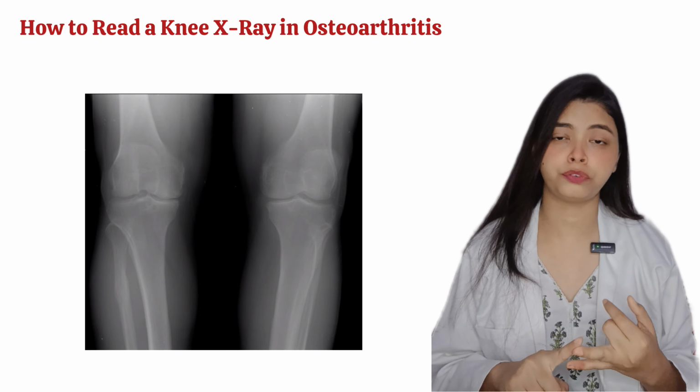Now let's discuss all the steps which are used to interpret knee joint osteoarthritis, and at the end of the video we will discuss real cases, and based on these steps we'll try to find out whether it is osteoarthritis or not. Is that clear? So let's start.